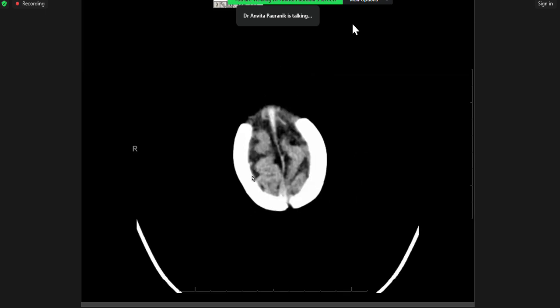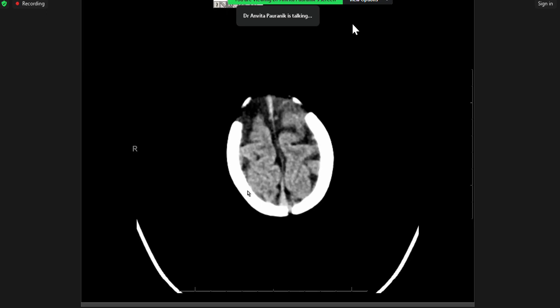Do we need a venogram? Do we need an MRI? And this is the fontanelle, right? It's a newborn, close to 1 month age. High hematocrit, dehydration, normal, CVT causing white matter edema. So there are very conflicting answers here, right? So how do you decide?